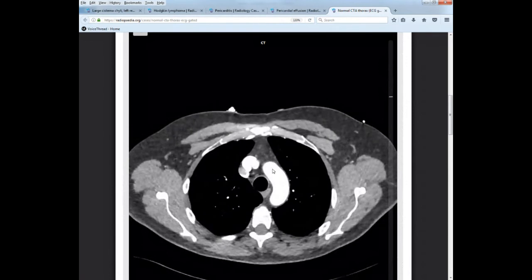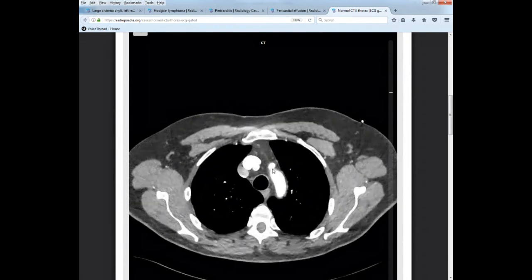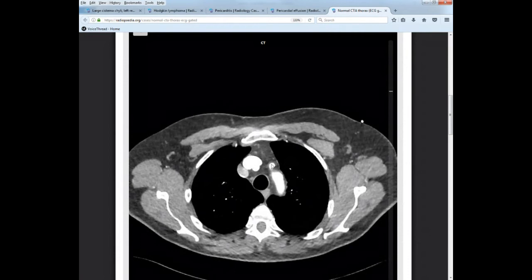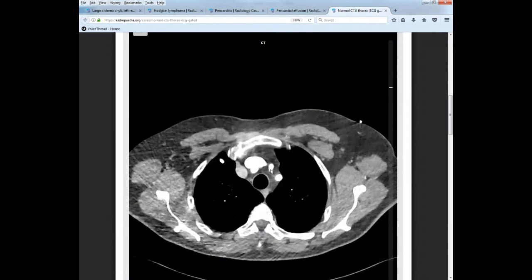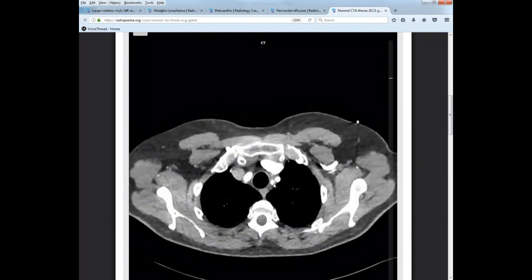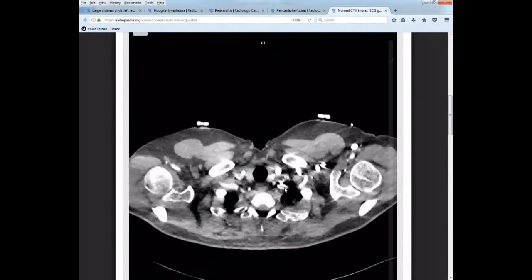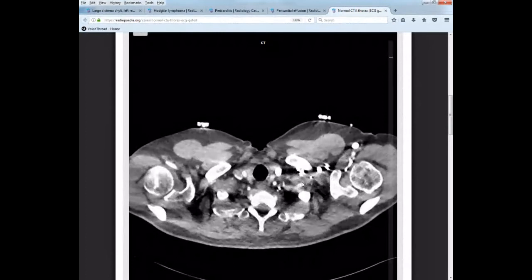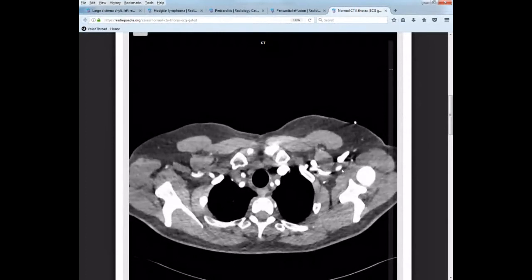Back to the aorta, let's look at the next branch. The very next branch I should see traveling from the right side to the left side, or from the ascending to the descending, is going to be my left common carotid. And here it is. Here's my left common carotid coming up, and then the very next one is my left subclavian. Okay, common carotid you should be able to follow all the way up into the neck, and then the left subclavian is going to take a turn and travel over into the left extremity right here.